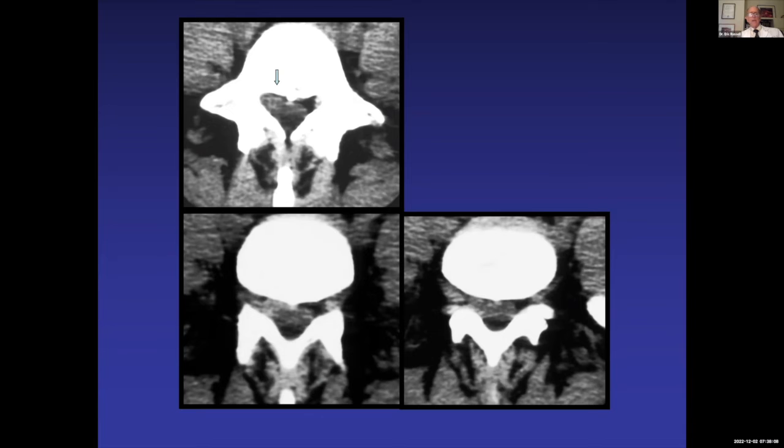This is the lateral recess. On the right, very little fat. You do see some fat ventral to that grayness where the fat is missing. If there were an extruded disc in the lateral recess, you probably wouldn't see that little thin layer of fat because the disc would obliterate it.